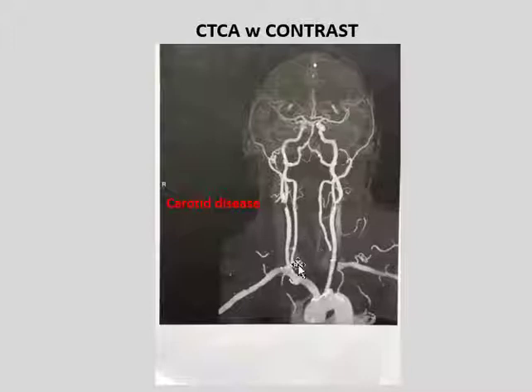up into the head. And you can see this very, very tight lesion here in the right carotid artery. So because of that anatomy, the patient is facing us, and this would be the patient's left side. Interesting that normally radiographers tend to put a little letter indicating left or right of the patient, and there it is right here. So that is the patient's right side, so he is facing us, and that we can confirm by looking at the anatomy.